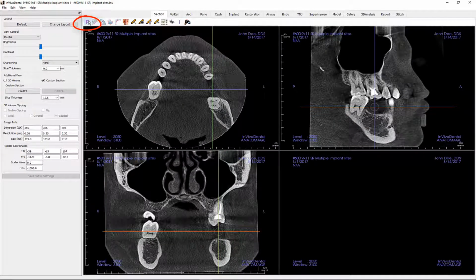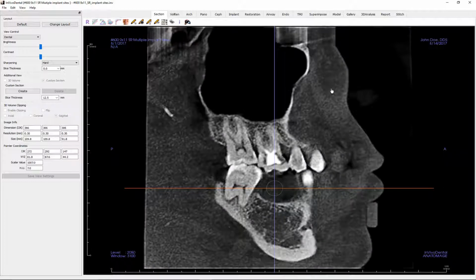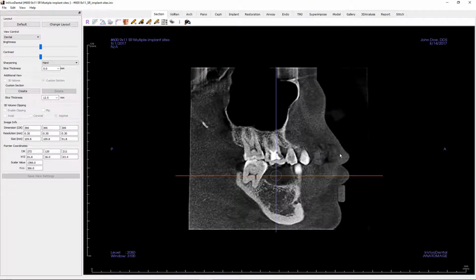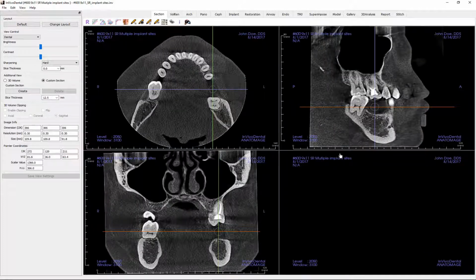You will see that a description of the toolbar icons will appear if you hover over them with your mouse pointer. The second way to increase the size of the image is to double mouse click on it. Use the aforementioned directions to zoom in and zoom out further. To return to the original view, double mouse click on the image again. You may want to move the image on the screen or pan the image.